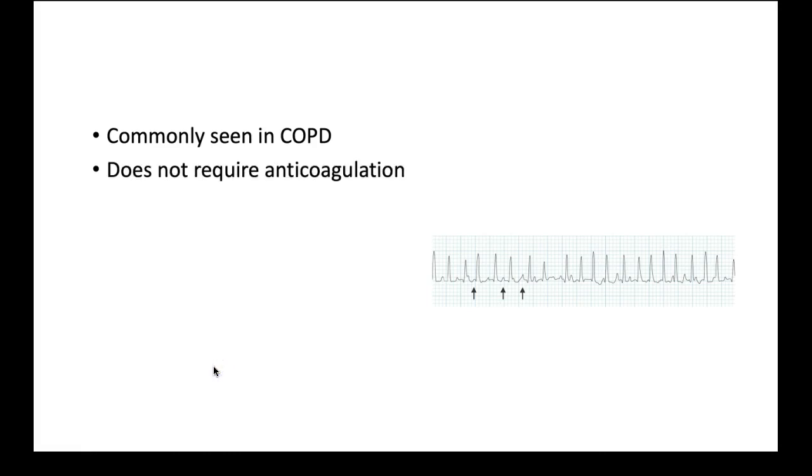Okay, how about this one? I put this EKG here because this is something that is very common with the older population, and particularly in this region of the country where we have a lot of smokers and a lot of COPD. This is very commonly seen in COPD. And you see that there's some P waves, but they're kind of all looking a little different, and you might even look at that again and think, is that atrial fibrillation? What is that? But there are P waves.